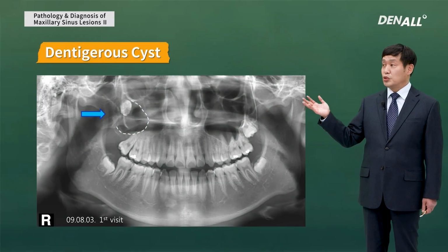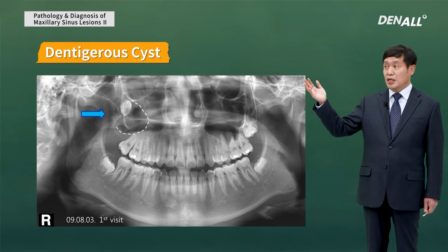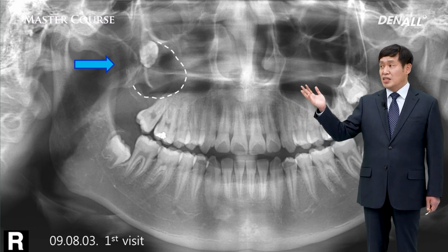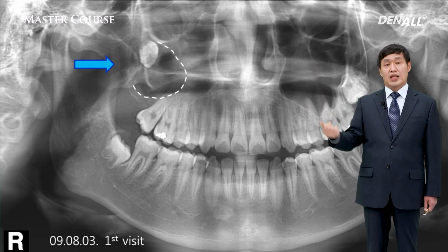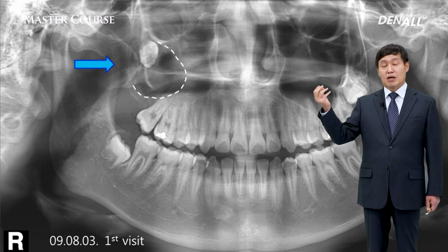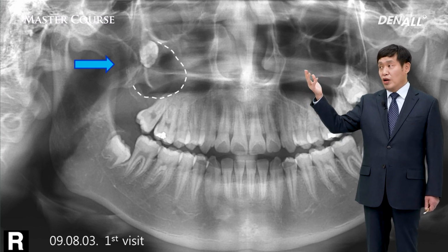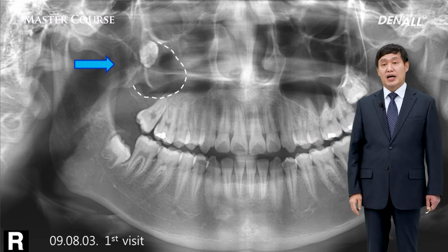Next, I'm going to talk about a dentigerous cyst. If you look at the panoramic image, in the white dotted line, there's a cystic cavity. There's an impacted tooth. It is deviated this way. Number 8, which was impacted, caused a dentigerous cyst within the sinus.